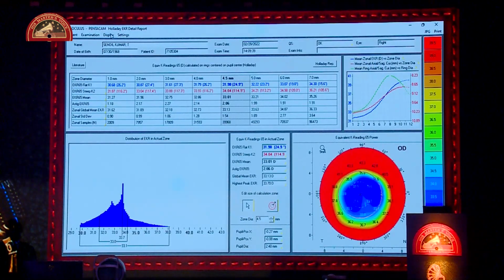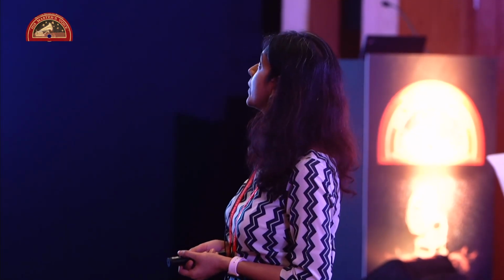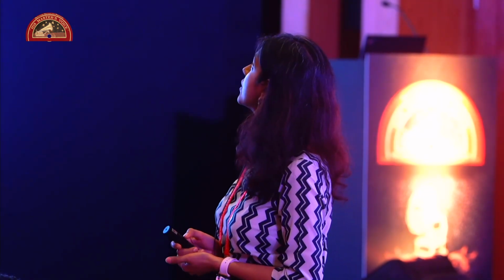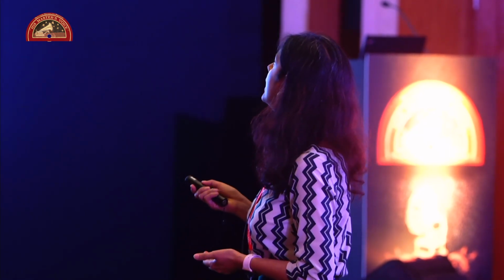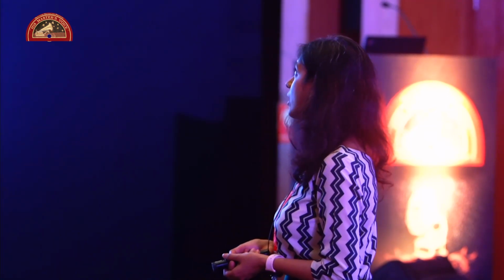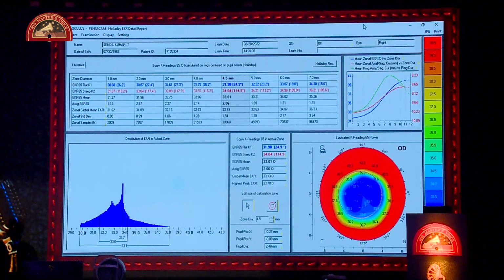So these EKR values are basically the anterior corneal values, and this EKR will adjust for the change in the anterior to posterior ratio of the cornea. These values for the various zones, 1 mm, 2, 3, 4, can be incorporated into the freely available online ASCRS calculator and can help us in determining the correct power for those eyes. Because if we use the SIM-K1 and SIM-K2 values, it will result in either overcompensation or undercompensation of the posterior corneal surface, since the ratio of anterior versus posterior has changed, and can result in wrong IOL power calculation.